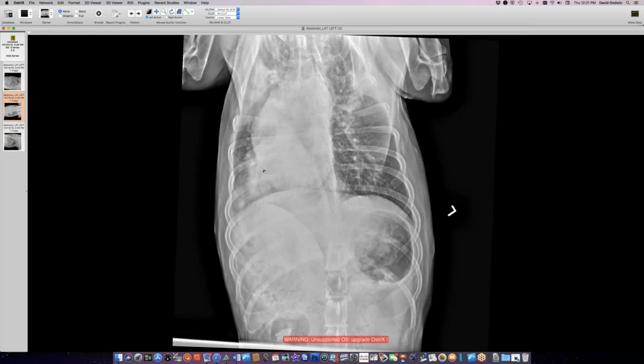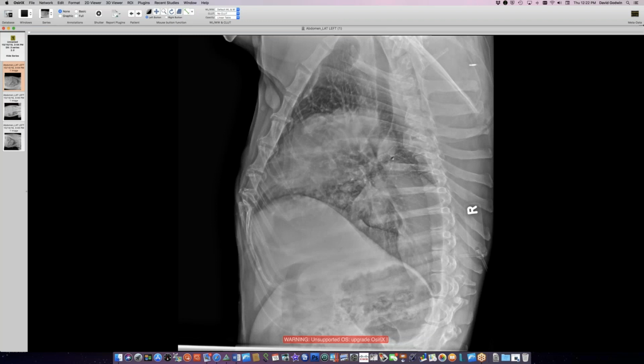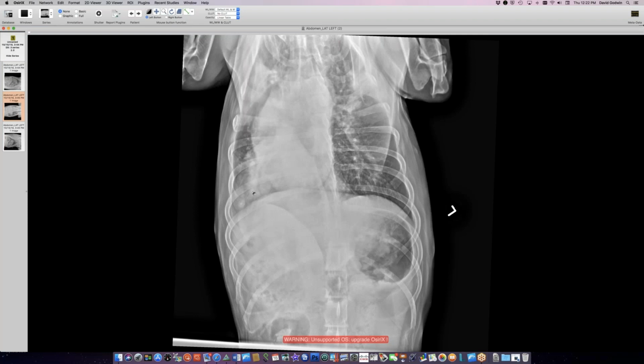Okay, now here's a patient with a cough, and the cough is all day, and it's keeping family members up at night. And this patient had a history of a neck tumor, a superficial neck tumor that was resected, and was not subject to histologic analysis, but was presumed to be a sarcoma. And that was about a year ago, because evidently there's a susceptibility to a particular spindle cell sarcoma. And there is consolidation in this right lung base here. You can see this triangular consolidation in this base down here. And there are some lung nodules elsewhere, so it's presumed that this is malignancy. It might be a primary lung cancer. It might be metastasis. Maybe there's endobronchial involvement.